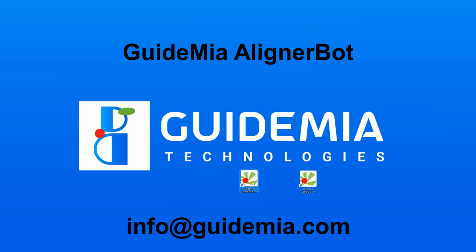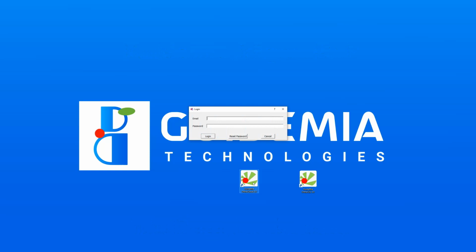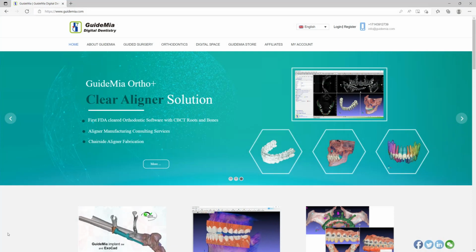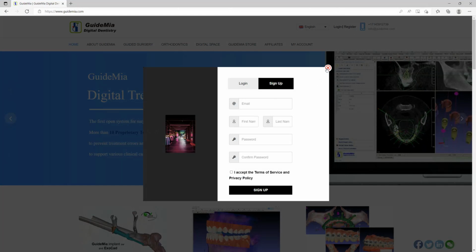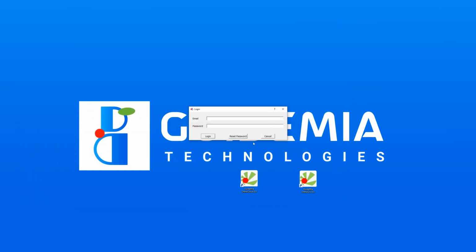In order to use this service you need to download and install GuideMia Ortho software on your Windows computer. After installation, you can see GuideMia Ortho Cloud and GuideMia Ortho Click icons on your screen. We use Ortho Cloud. Please contact us to get the software and a license code, or visit to place orders. When you start the software, it asks for username and password. Please register a user account on the GuideMia website first, and log in here.